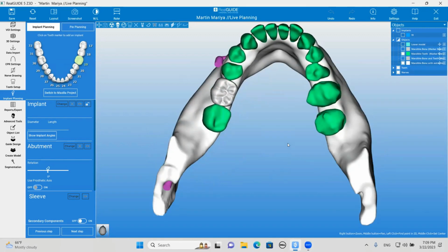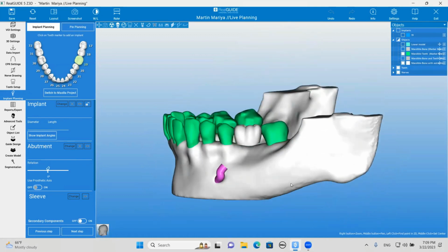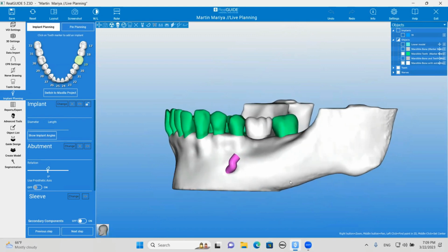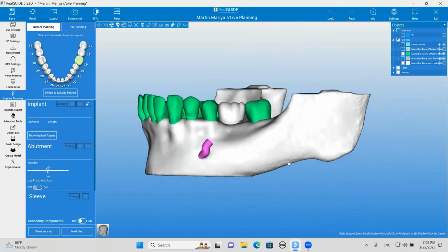And let's look at it from the facial aspect. So hold it right. Let's look at the lingual there, or the antegonial notch. So show them the antegonial notch. So is this a female or a male? Did you say female? Female.